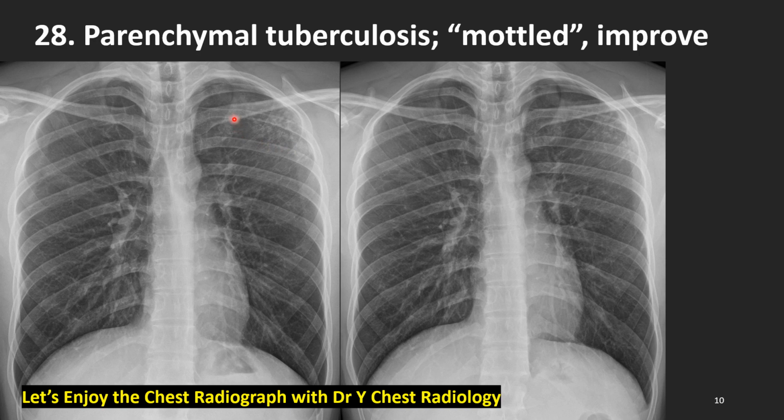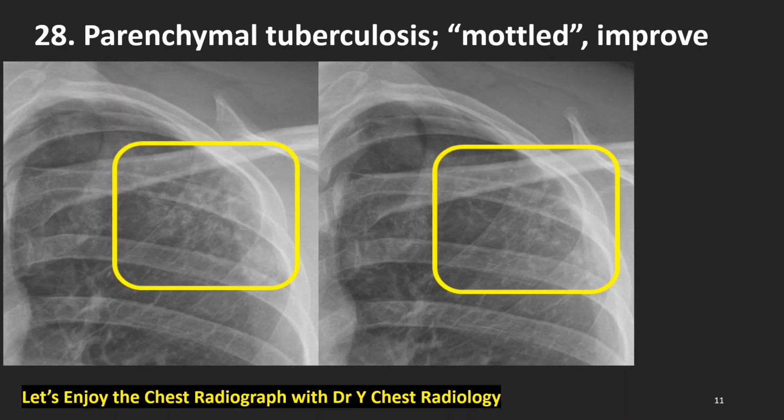This is active TB. This is the magnified view. Let's enjoy again. Please enjoy yourself the mottled, centrilobular nodules, tree in bud pattern here. Yes, it has changed after therapy, treatment, improved and get stable again.